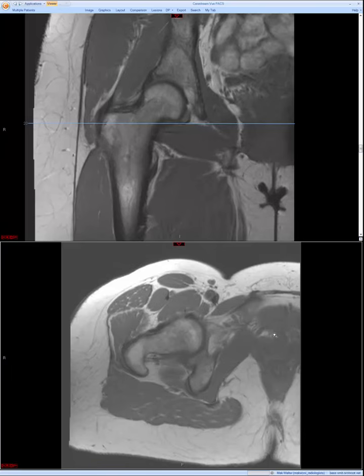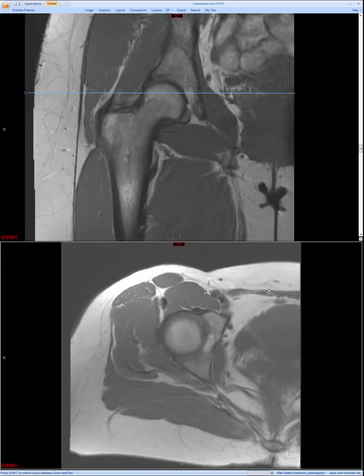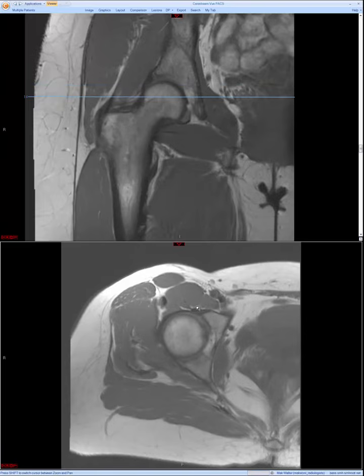So in the next subsection, I'm really going to focus on just pointing out where all these structures are, and then we would apply a similar analysis as you would for tendons in the knees and the shoulder to interpret the integrity of these structures. Let's start with the iliopsoas, since we had already mentioned it in passing in the arthrogram section. So here's the iliopsoas.